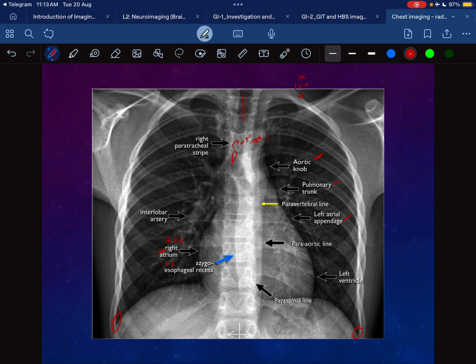Once we do that, we make sure there is no abnormality. You have to see many normal ones, so we can assess what the abnormal looks like. So it's good to keep your eye looking at all the chest X-rays you encounter and read the report, so you can know how the normal looks and then what the abnormal should look like.